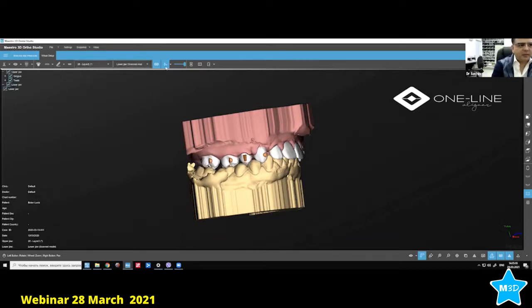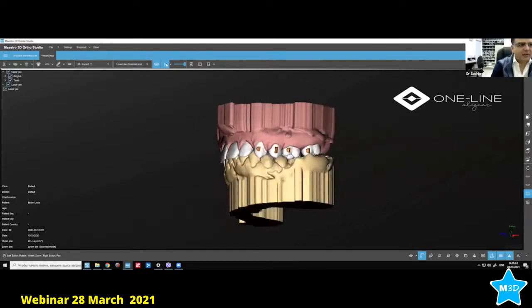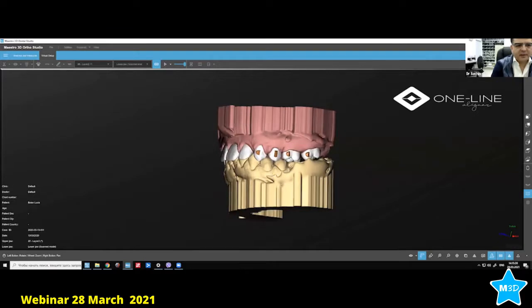Here, what we did was we retracted, rotated the canine, and moved the premolars all together. Why? Because the canines were almost class 1 here. So this was a good case for us. The mistake was the attachment on the molar on the 2/6 was not correct in the beginning. So this was my mistake.